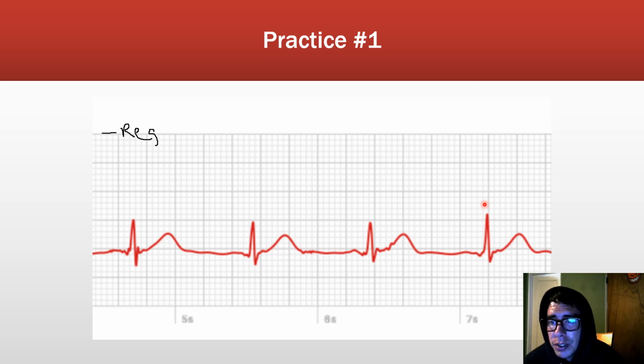So usually we just use that, but I've been known to do it this way backwards. I don't know if that's okay or not, but it's always been the same as what the machine says, so must be. But we'd count 300, 150, 100, 75, and a little bit more. So it's going to be somewhere below 75, in the 74, 73-ish range to 75.